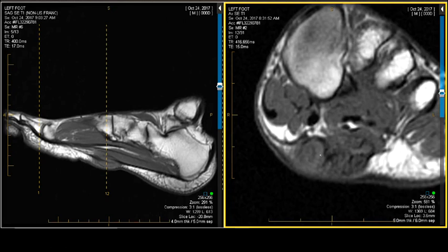Now, there are other fibrous lesions you can get in the foot, but they're much less common. In an adult male, this is going to be 80% of them. You can get fibromas. In children, you can get aggressive fibromatosis or childhood fibrosarcoma. That's a very bad disease. That's much different than this. You can also get in juveniles calcified aponeurotic juvenile fibroma. They're calcified. These never calcify. So if you see calcification on plain film, you got to think about another potential diagnosis.